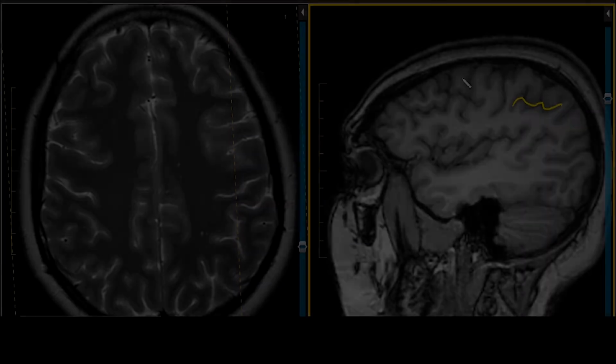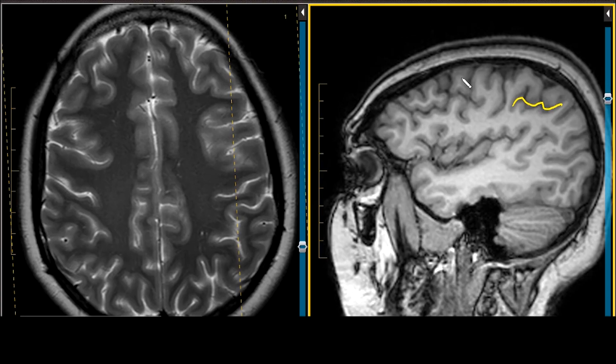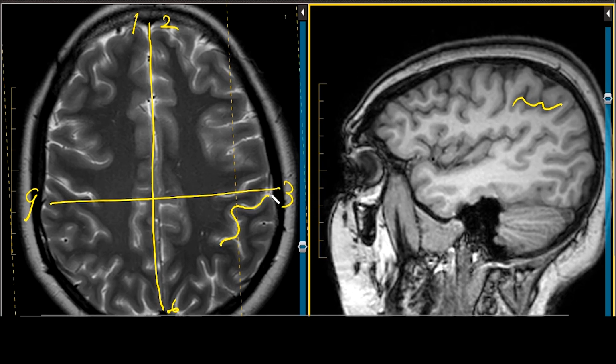It's very deep. But if I were to show you exactly where that spot was by cross-referencing it, it corresponds right to this locus right here. Now we see part of it on this one cut. And if I was to take the brain, as we did before, and divide it up into 12 o'clock and 6 o'clock, then we have at the widest biparietal diameter, 9 o'clock and 3 o'clock, something like that. And then we're going to take this sulcus, which goes from 3 o'clock, and it usually lands somewhere around here at around 5 o'clock. And then on the other side, this would be 7 o'clock. We can actually see it here at 7 o'clock.